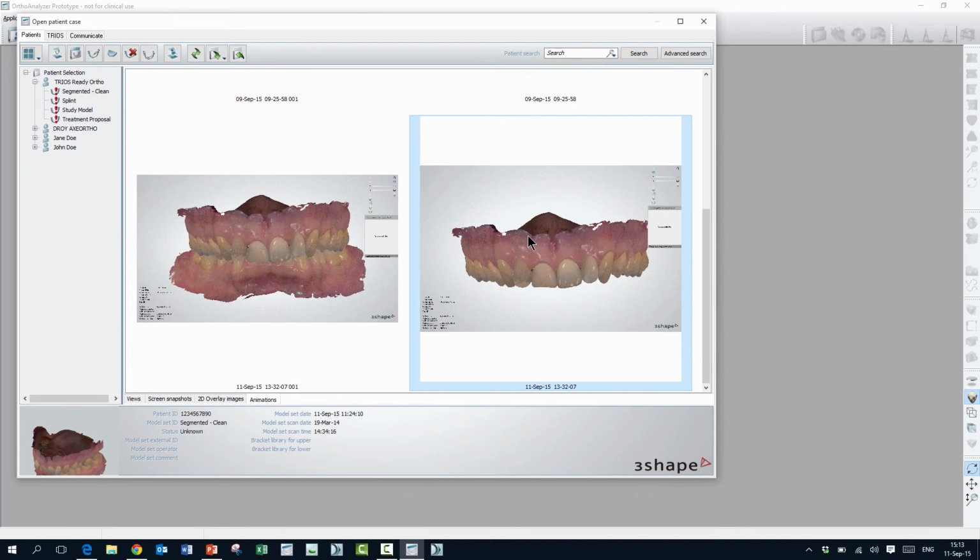A few more things I want to show you. When you right click the file, you have an option to choose another program to open it with, or you can use save as, and then you will be able to save that GIF file on your local PC.